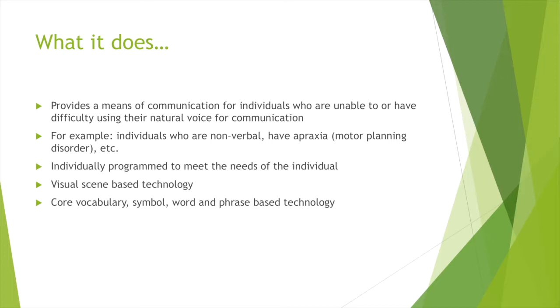The Dynavox Compass application can be individually programmed to meet the needs of all individuals, depending on the level that they're at. You have the option to do visual scene-based technology or core vocabulary, symbol, word, and phrase-based technology.